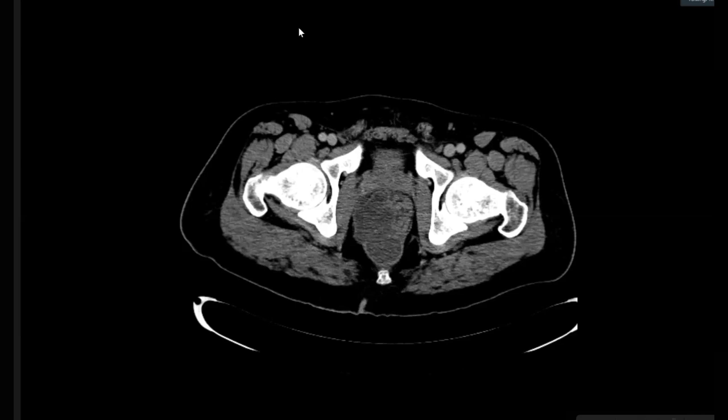There is no lymphadenopathy in the region of the iliac vessels. The iliac vessels are of normal caliber. The in-view wall of the abdomen is okay. However, I can appreciate slight asymmetry of the muscles in the left wall of the pelvis. It can be due to a single slice provided. Consider it normal. The in-view bones are also okay.